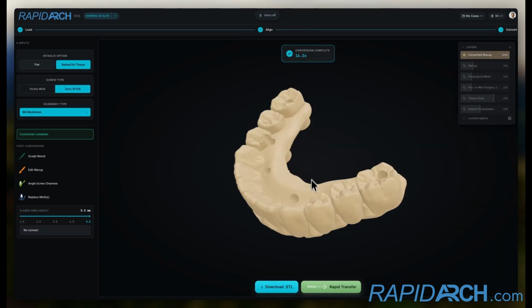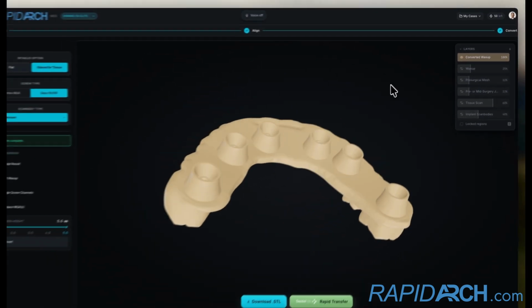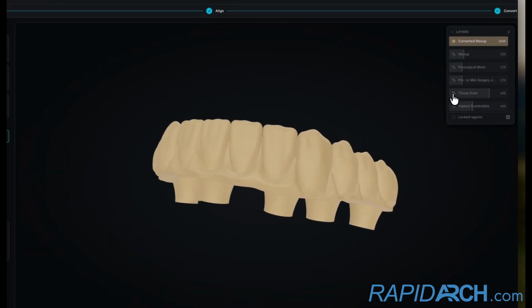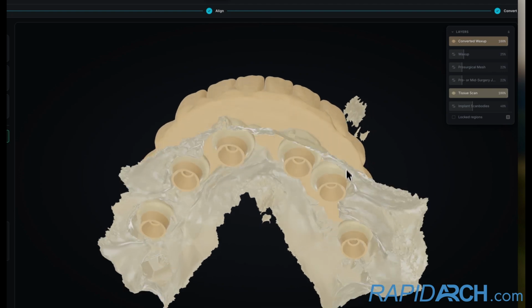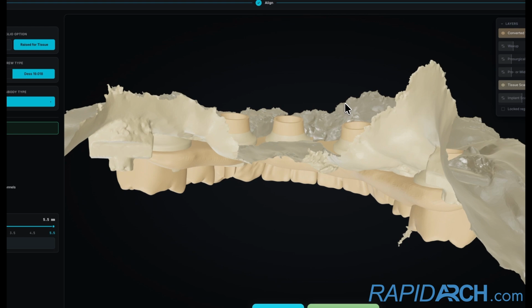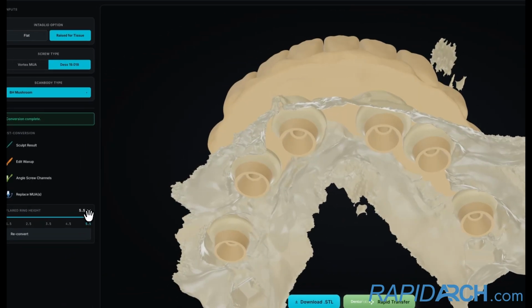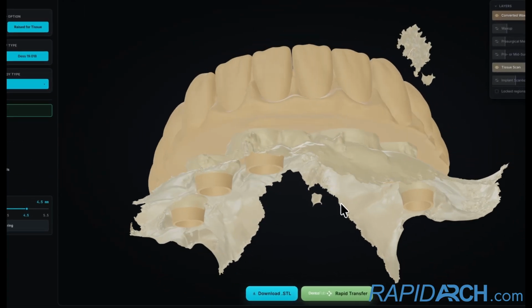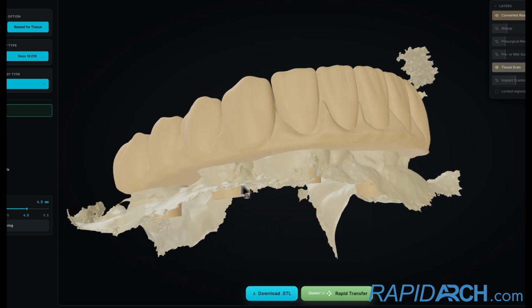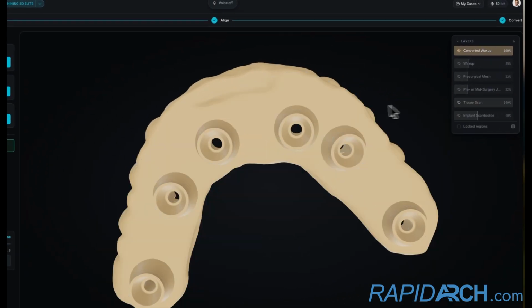Okay, there we go. Another 15, 16 seconds. So this looks way cleaner for me. Let's take a look at the tissue scan. Let's open that up. Okay, this looks like it's going to be way more comfortable for the patient, so you can deliver this right away and they're hardly going to feel a thing. If you want, you can even reconvert it with a 4.5 millimeter height, and I think that should be okay for the patient as well, because over here I see a little bit of a gap, but elsewhere looks pretty decent actually. I'm happy with this result.